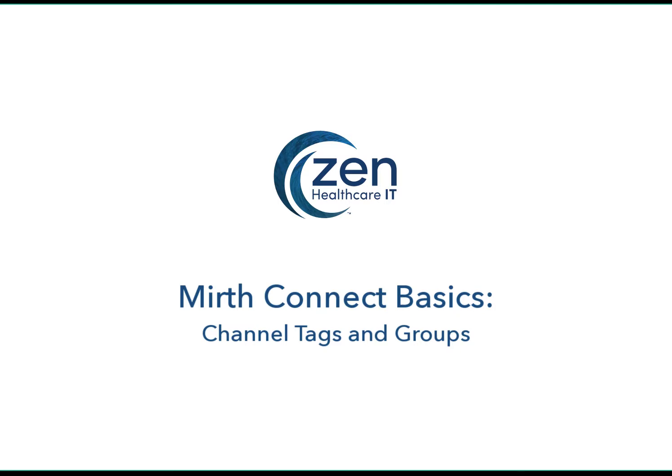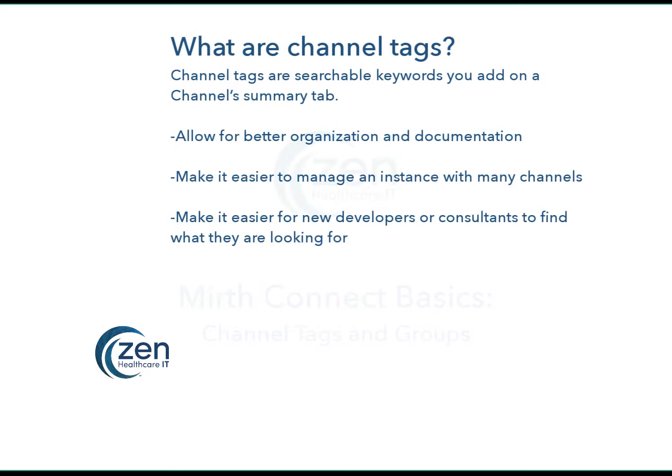Today we'll be exploring channel tags and channel groups. These are two very simple but powerful tools in Mirth Connect for keeping your channels organized. Let's begin with channel tags.